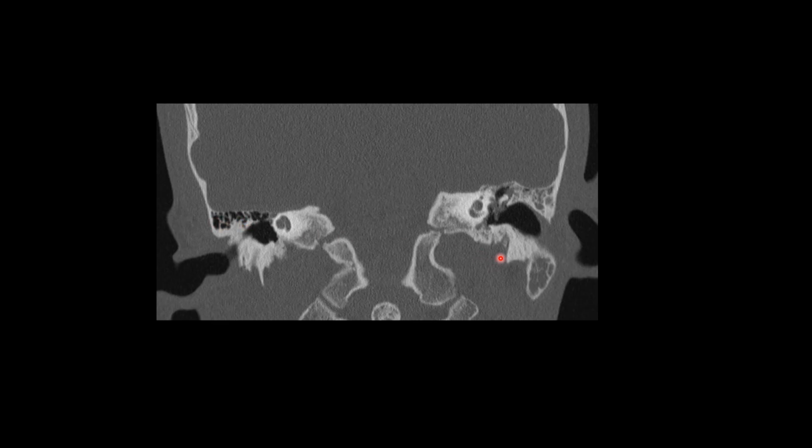In the symptomatic left side, we can see the gray density filling all the left-sided mastoid air cells, as well as the soft tissue gray density within the mesotympanum of the middle ear cavity, as well as this gray density in the epitympanum of the left middle ear cavity. There is no bone erosion, all the bones are intact. So these findings are suggestive of left-sided otomastoiditis.